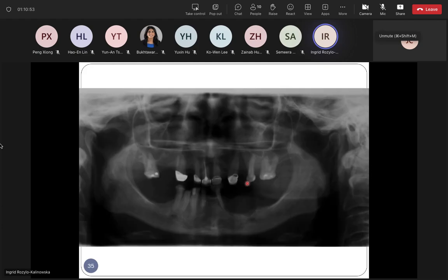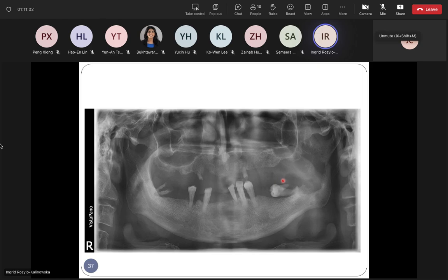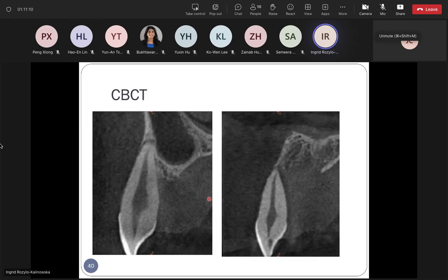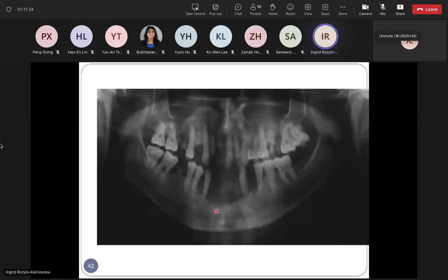And in any of these cases, you have to remember that what you can see as the infiltration of a bone, most probably is just the tip of an iceberg, and there is much more to be seen as infiltration in soft tissues, just like in this patient. So this is bone destruction. This is the extent of the soft tissue lesion. Same here.